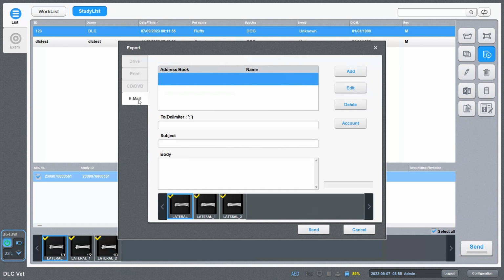There's a lot of behind the scenes configuration that's needed. So I won't exactly go through this one now, but if you guys want to go ahead with a Gmail account and use the email function, just reach out to us here at the service team. We'll log in. We'll help you set it up. In a nutshell though, you're just putting what email you want to send it to, a subject, a body, and then you're pressing the send button. Once again, we'll go into email a bit more in depth if you decide to want to try it, and then we'll log on, we'll get it activated with you, and then we'll run through it.